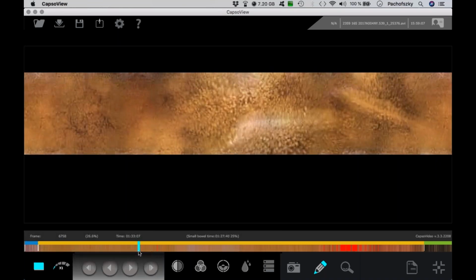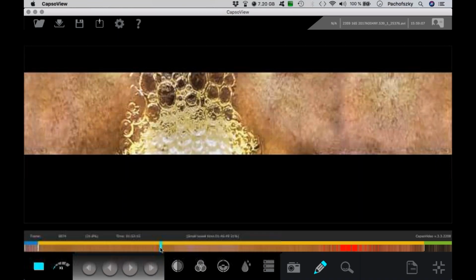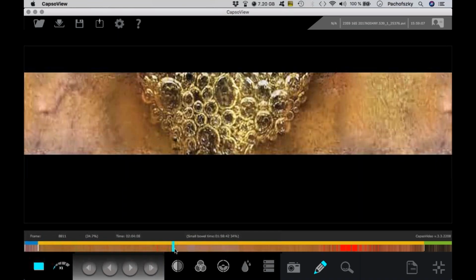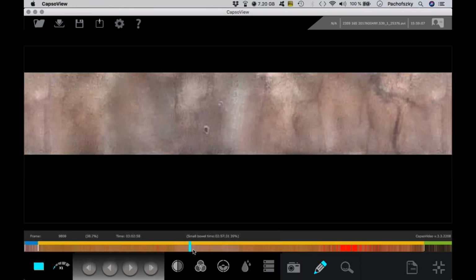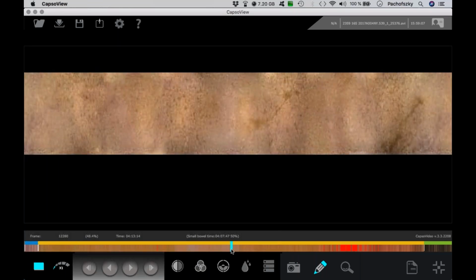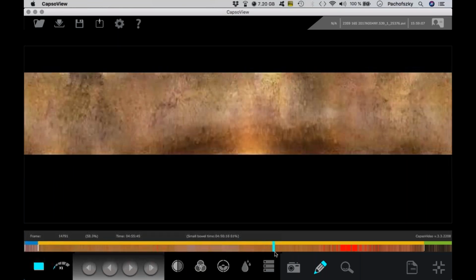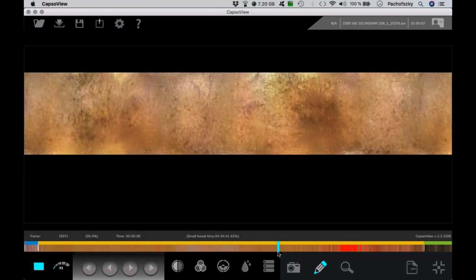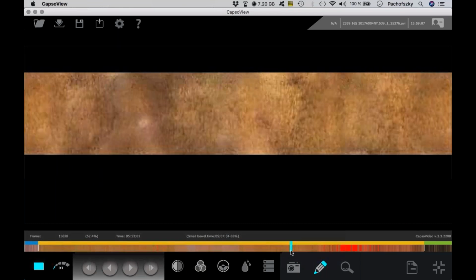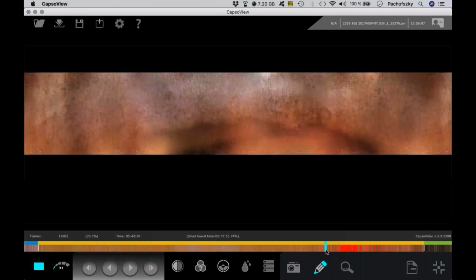It's the main indication for the capsule endoscopy. So then you know, okay, we have to go on with the reporting to see where is the bleeding source and how to solve this problem. Do we need a surgeon or an X-ray or an enteroscopy, and plan it as far as possible?